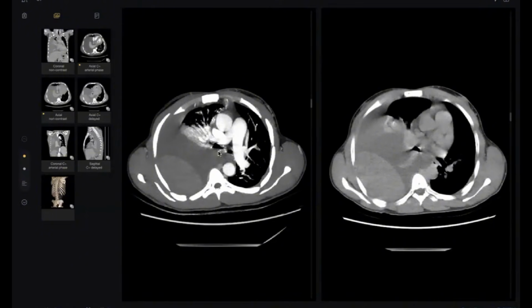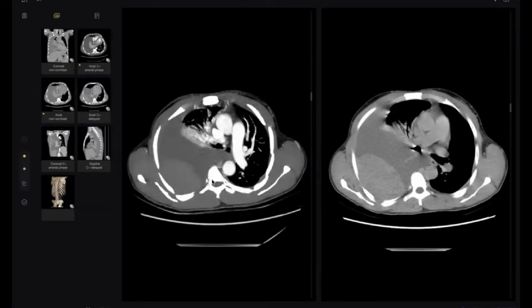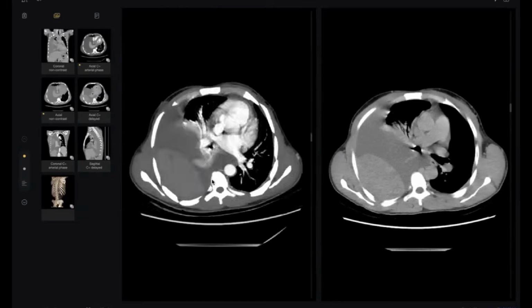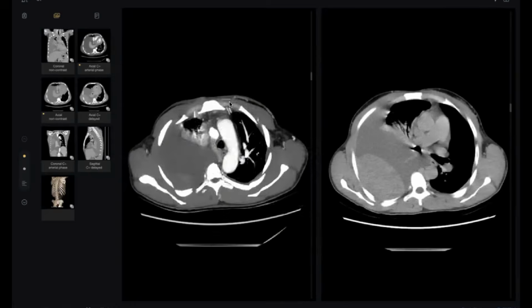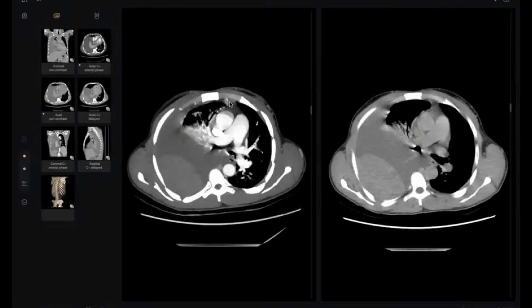Do you remark any difference in this? What is the name of the technique here? The technician used one of the tools of the software here. What do you think? Which option does the technician use? It is MIP imaging. Excellent. This is MIP, my colleagues, very important.